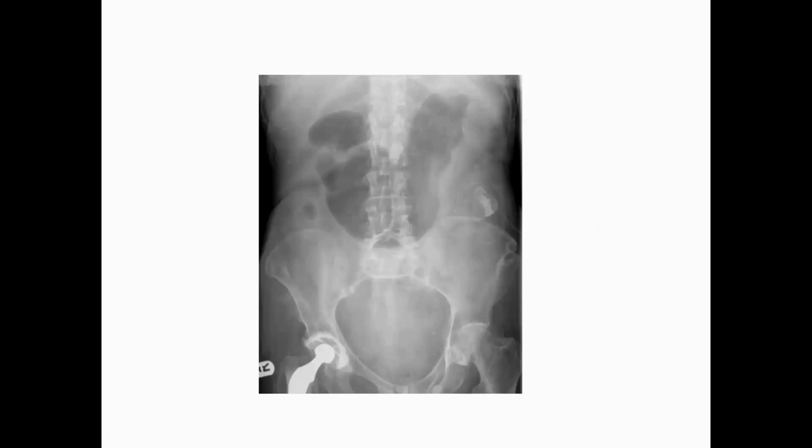Let us discuss one picture of an abnormal stomach, then we will go to the normal gas pattern of the small and large intestine. This X-ray demonstrates a distended stomach and a few bowel gas shadows elsewhere.